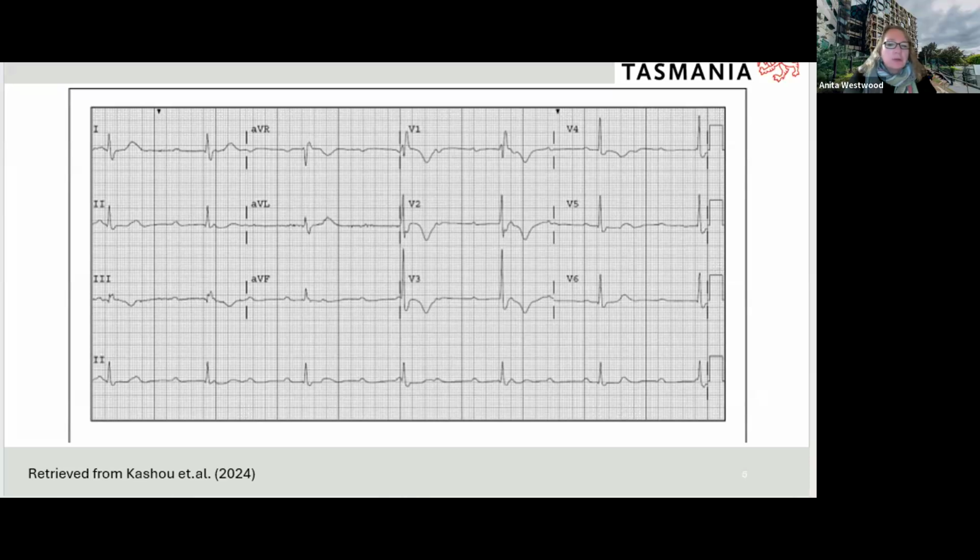If you've got the lead strip across the bottom, you can choose whatever strip you want to run on the bottom as your main monitoring lead. Most people will use lead 2, but it comes back to whether it's calibrated properly, which is the first point when you start with an ECG: make sure it's diagnostic. Then every ruler that you use is going to be correct.